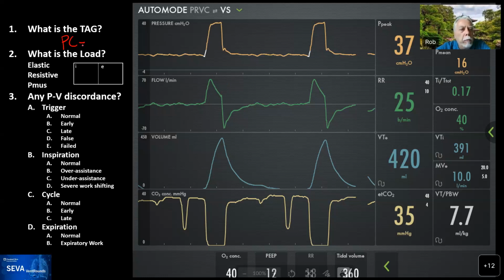These are patient-triggered breaths, okay, because you can tell from the white, these are in the pressure waveform. So these are pressure-triggered breaths. It's hard to appreciate whether or not they have the same inspiratory time or not, but I'm going to cheat and look at the name, volume support. And the VS is highlighted, or lit up in white, so that means these are spontaneous breaths, patient triggered, and flow cycle, patient cycle.